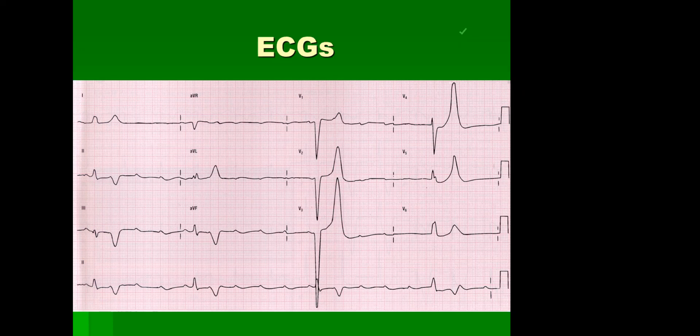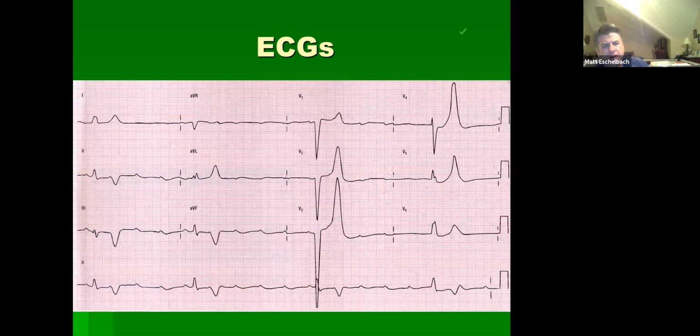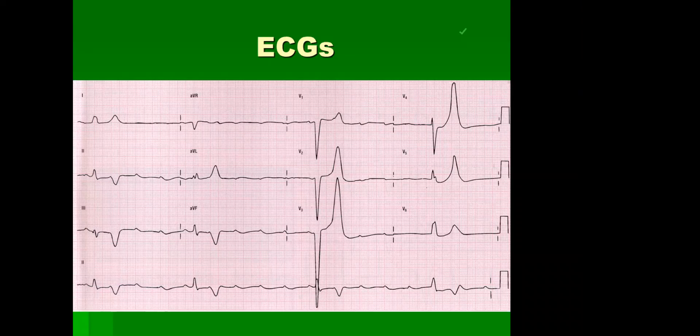Lead 2, 3, looks like in 2 there is some depression. Okay. Lead 3, not enough to tell if there is a depression or elevation. There's not enough QRS. It is a bradycardic rhythm. Okay, there you go. All right, it's a bradycardic. How slow? About 40 beats per minute.